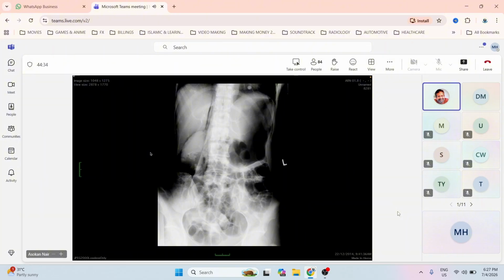Sphincterotomy. Yes, when they do the sphincterotomy, because they will cut posteriorly, right? They won't cut anteriorly, so they can get perforation, and this is what you will see. So if you end up reporting a post ERCP radiograph, this is something you look for.